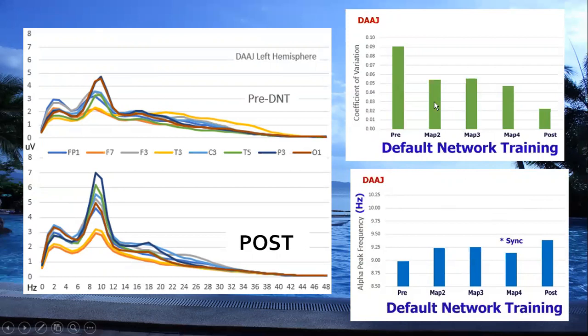It's going up. But more importantly, are all the systems firing similarly? Because think of your brain as an assembly line, and if two or three elements are too slow or too fast, you're not going to have as strong and as rich percepts as you possibly can. You can see the slowness here, the slower peaks here, and I just chose the left hemisphere because if I show all 19 electrodes, it's going to be chaos, just a bunch of lines.